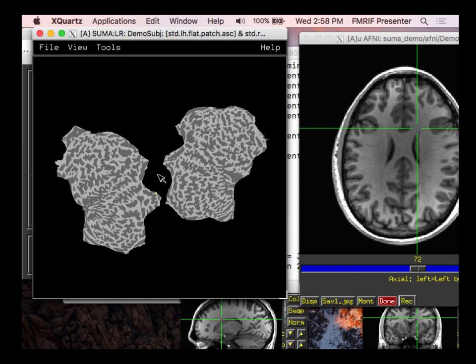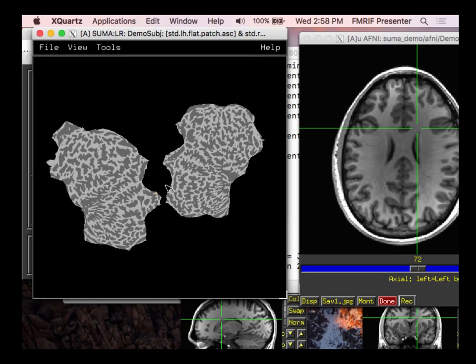And we can view it. This always reminds me of big game hunters or something like this, and then they kill a zebra and squish it on their hearth. I'm a vegetarian, it's okay, I can say that.